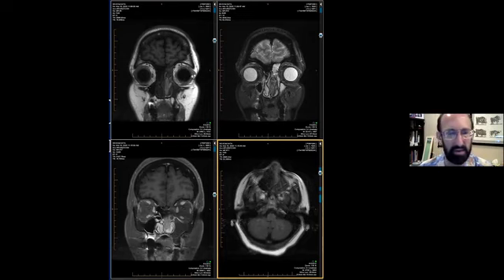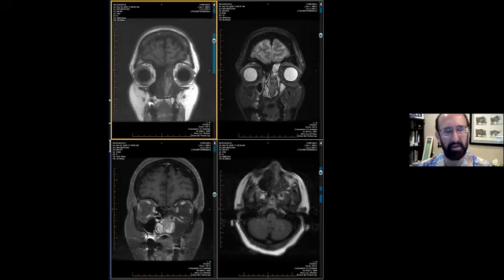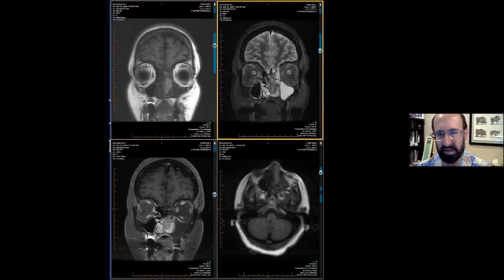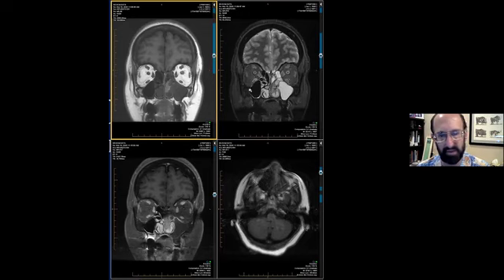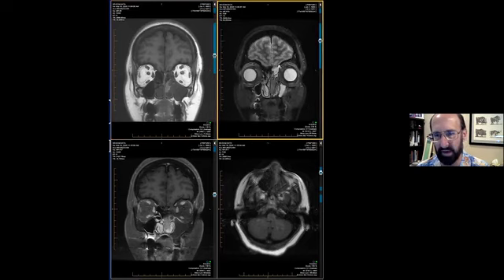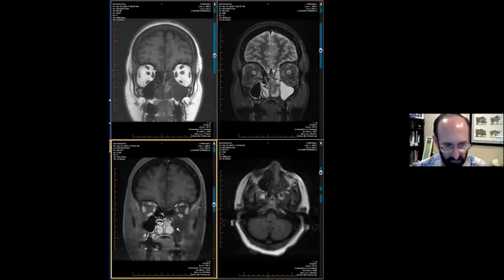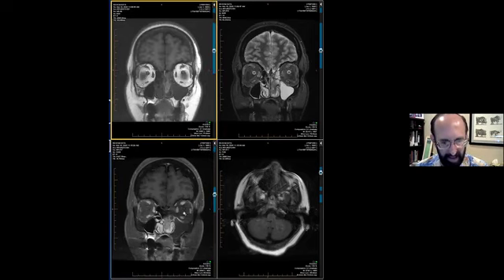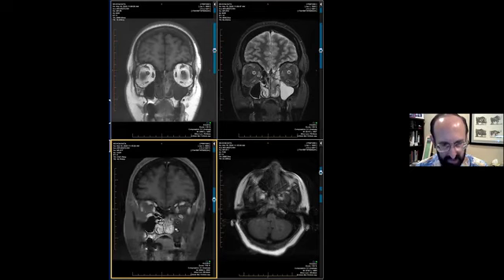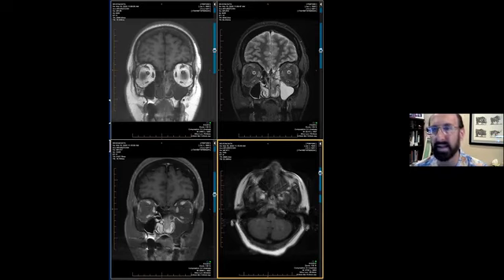All right, so on the T1 weighted pre-gadolinium scan, we see area of high signal intensity in the left nasal cavity. On the T2 weighted scan, you have dark signal intensity. You have within the left maxillary antrum and ethmoid air cells and frontal sinuses areas of high signal intensity. And when we give gadolinium, we notice that this lesion, I'm not sure whether it enhances given how bright it was on the pre-GAD, and the sinuses in the maxillary antrum and ethmoid and frontal sinuses are not showing enhancement. And again, here's that same lesion. Let's see if I have a better looking T1 pre-GAD.